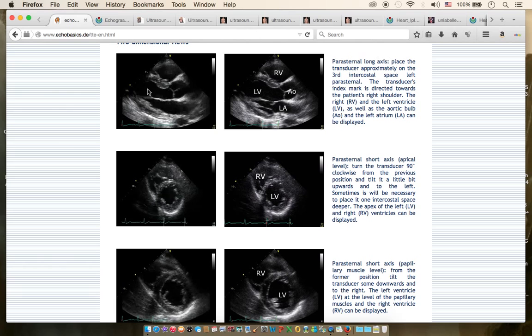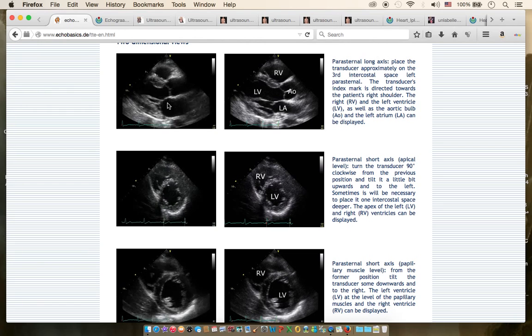And when the blood fills the left ventricle, the 2 mitral valve leaflets start closing, rising up and closing against each other. But as I said, 25% of the blood is left in the left atrium. Now the left atrium contracts, ejects, and opens it again. So this is the mitral valve.